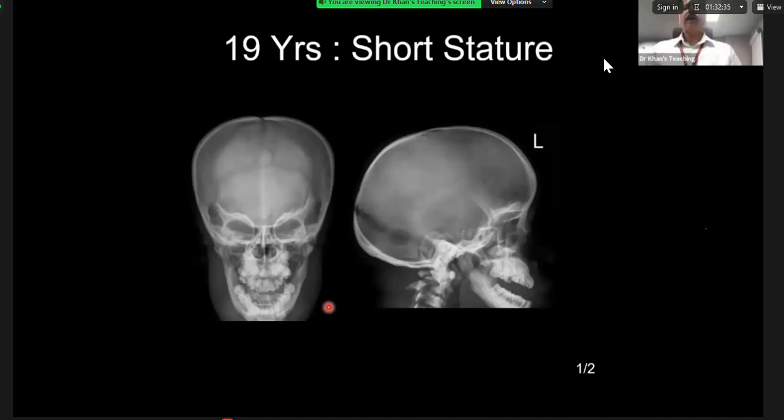Okay. Of course, because of projection, it might not be visible to you, but look at the bone density. There is a bit of sclerosis. If you look here at the base of the skull, you will appreciate there is a bit of sclerosis. Look at the orbital margins, and they are all sclerosed. Bone density in the exam is always difficult to pick up at times because of projection, but the examiners are going to help you.